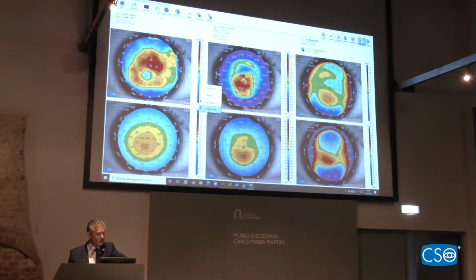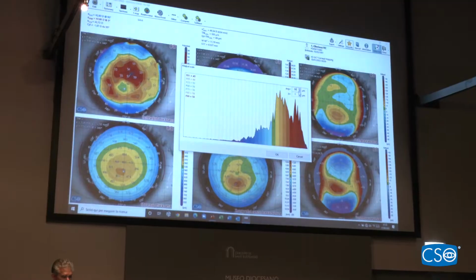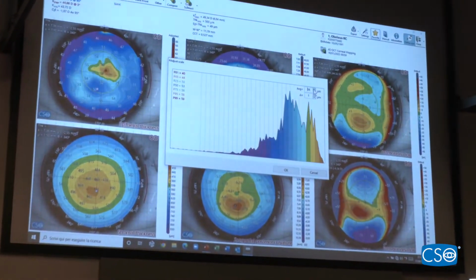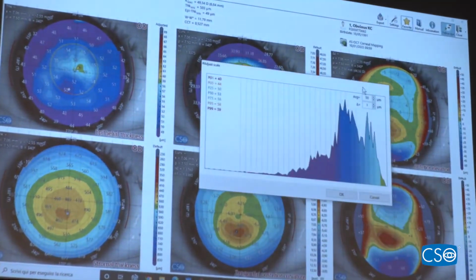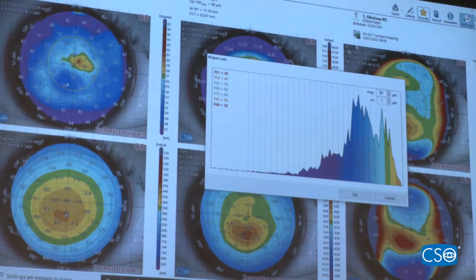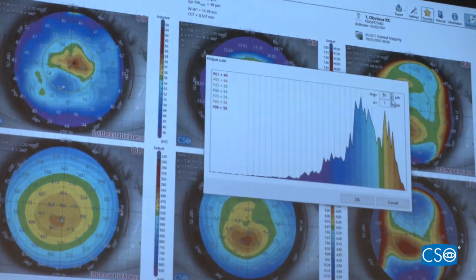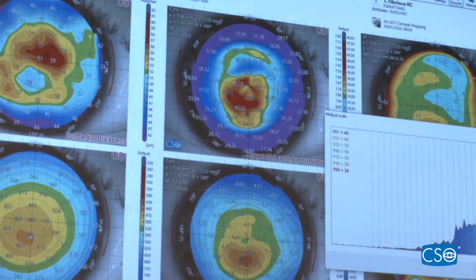And also, you can adjust the scale. So you can change the point at which the break point between green and blue, which can be used to emphasize things. So for example, if you don't adjust color scales, if you just glance at this, it doesn't look so abnormal. It's exactly the same data. But if you look at it like this, then it looks very scary.